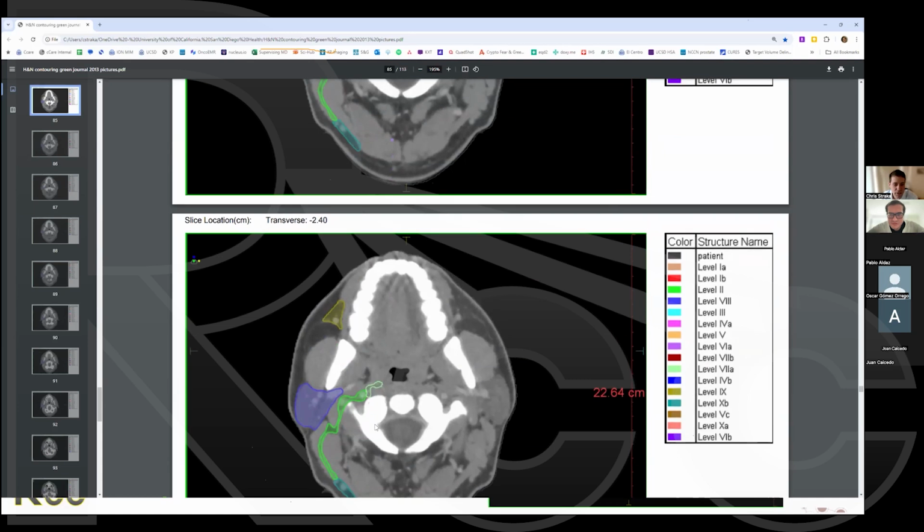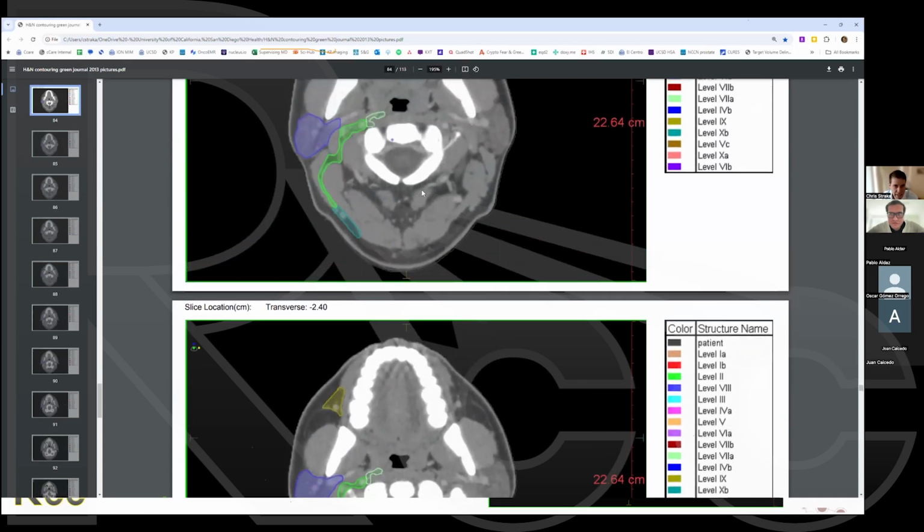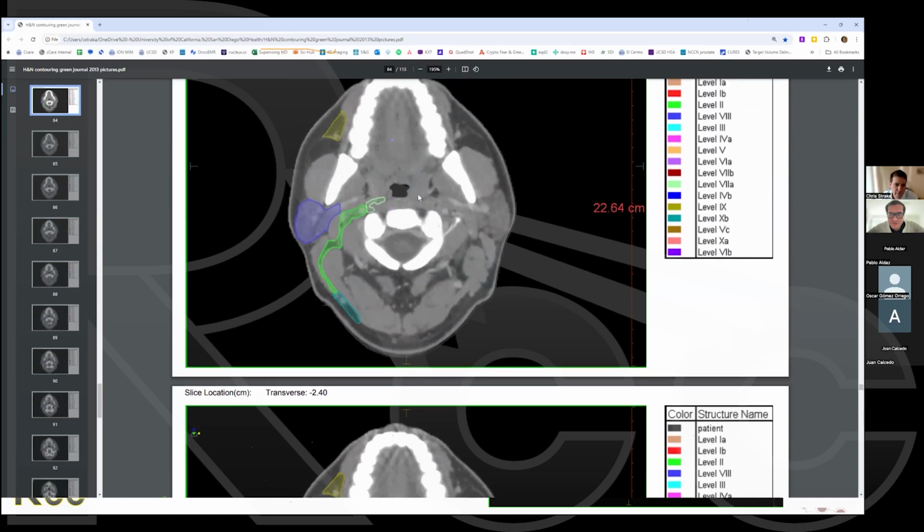But just to track these, so these RP lymph nodes, retropharyngeal, which is the 7A, these do go more inferiorly. For patients where you're very confident that these do not need to be included, you can confidently end your level 2 contours. You can put the medial border level 2 contour at this carotid artery, and that does, of course, give you better dosimetry for sparing these medial structures, the oral cavity, those constrictor muscles, and pharynx.